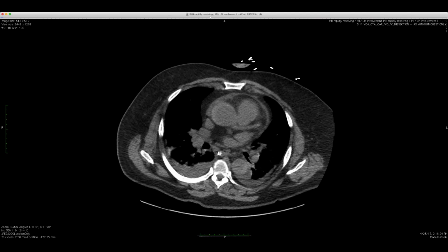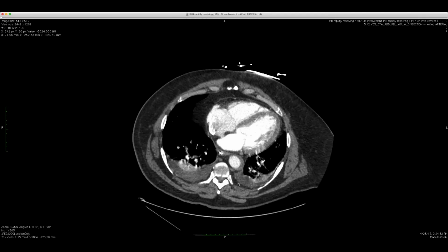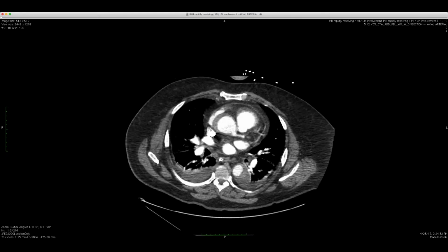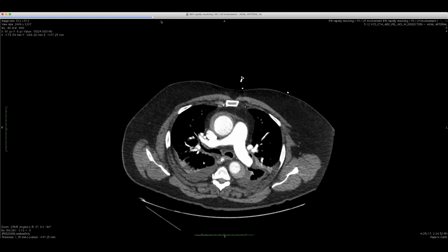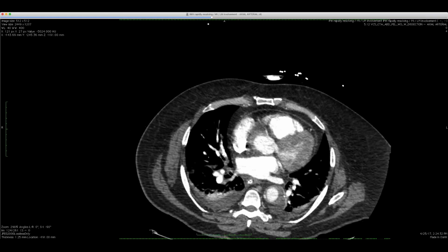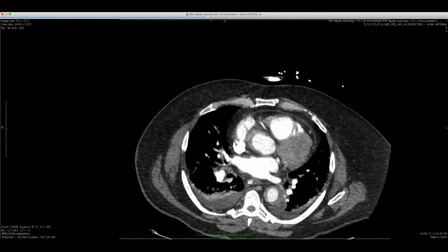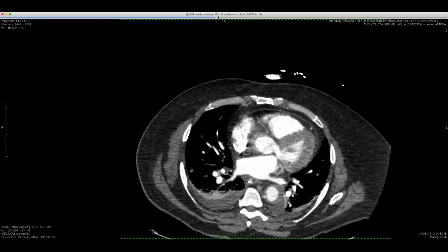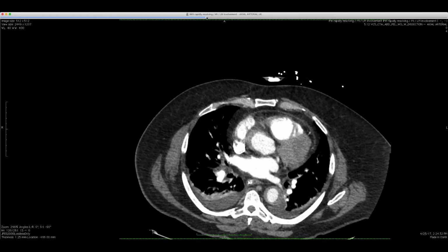Let me just show you one last interesting thing that you typically see with an intramural hematoma. We talked about these before, intramural blood pool here in the descending aorta. Let me find it right here. You can see this right there, that side branch pseudoaneurysm or intramural blood pool down there in the descending aorta. Normally you see it connecting with an intercostal there. Normally we'd see that in intramural hematoma.